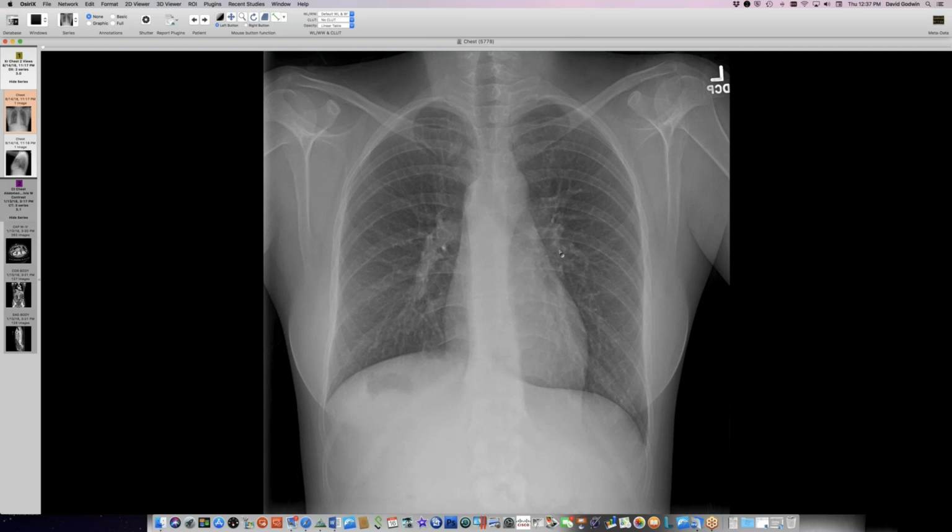Yeah. The interface of the azygoesophageal recess projects too lateral relative to the spine. Right, it's very sharp. Up and down, but it's too much to the right side. The actual azygous vein up higher doesn't look that big, but there is something related to.